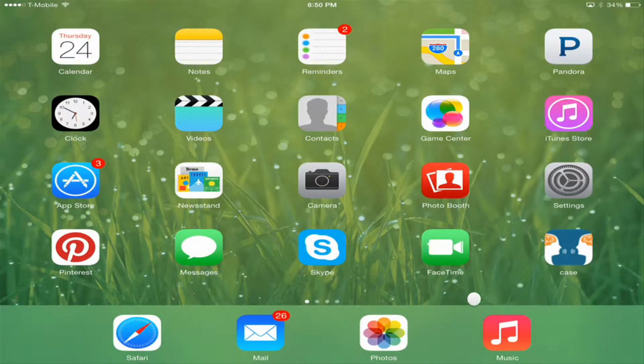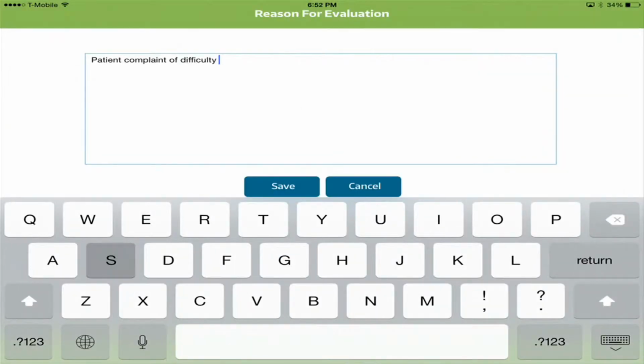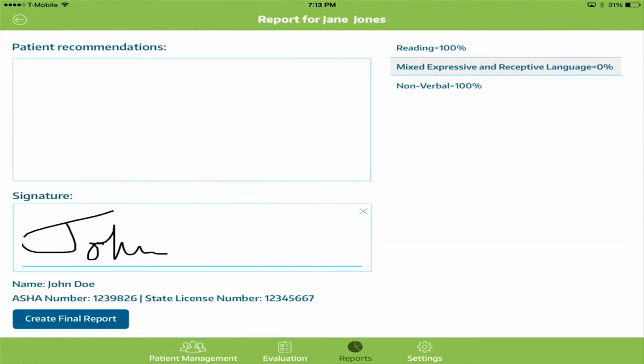Hello, and welcome to CASE, the best new way to evaluate your patients comprehensively. This video will highlight the features of using this app so you can quickly learn how you can implement it during your evaluations.